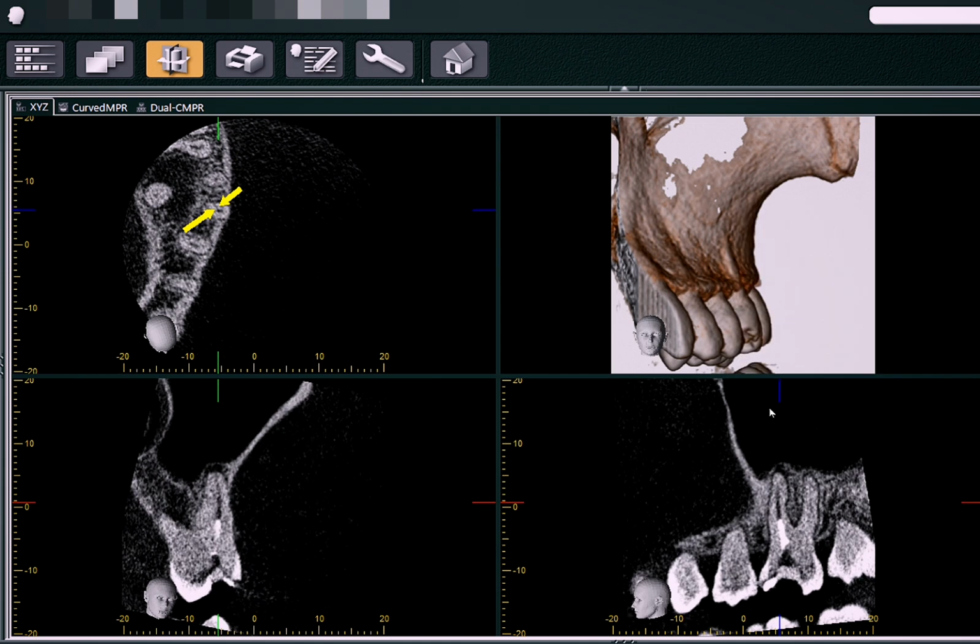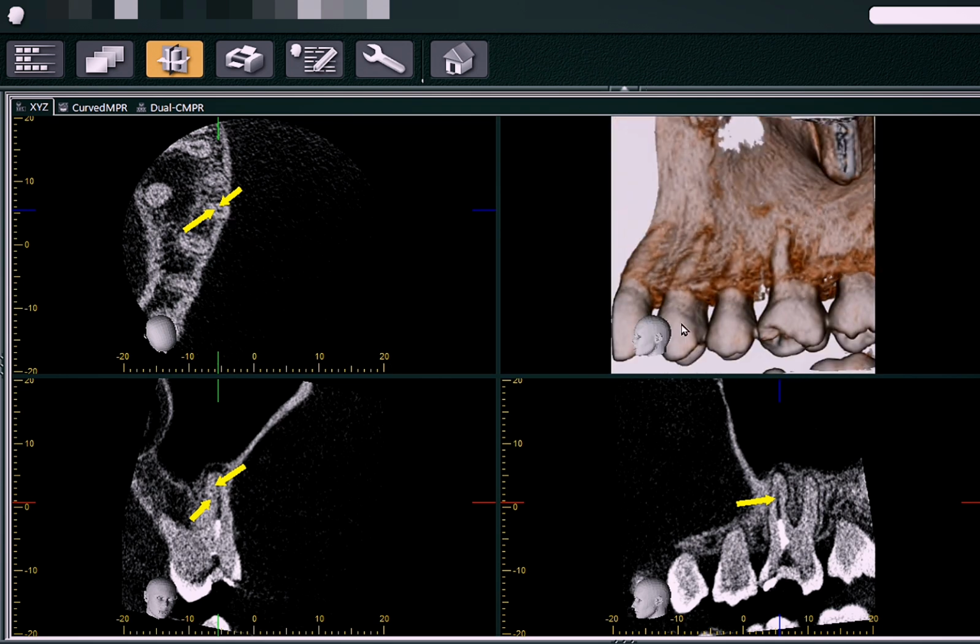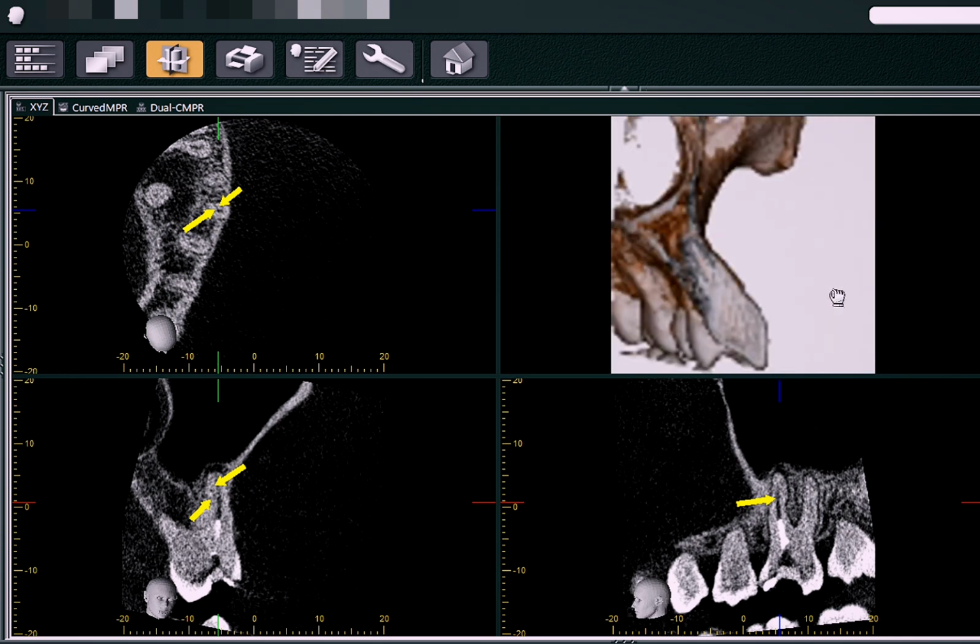You can see the similar lateral canal that is seen in the coronal aspect as a radiolucent thin line, and it may just appear as a single dot in the sagittal cross section. Okay, so the lateral canal is also responsible for periapical pathosis, especially on the lateral aspects of the root, and hence it is very much necessary to fill the lateral canal as well.